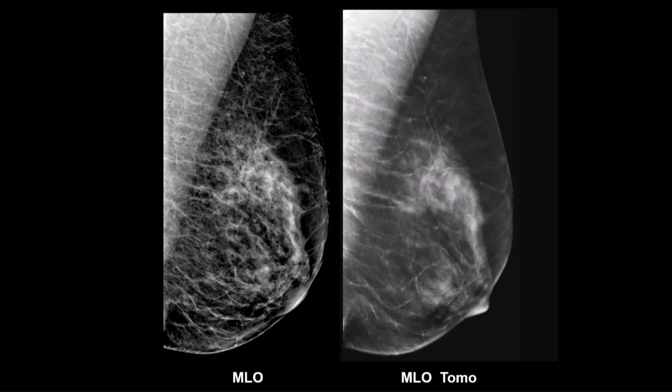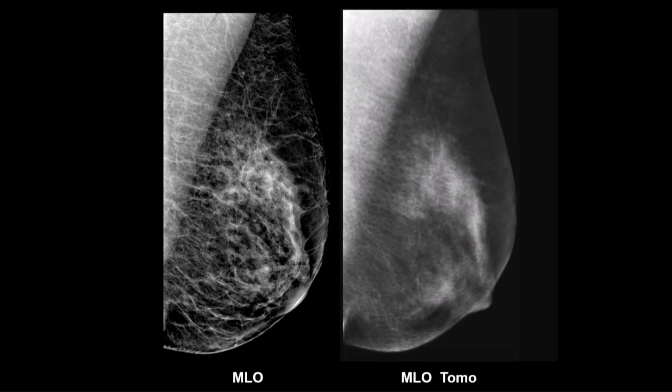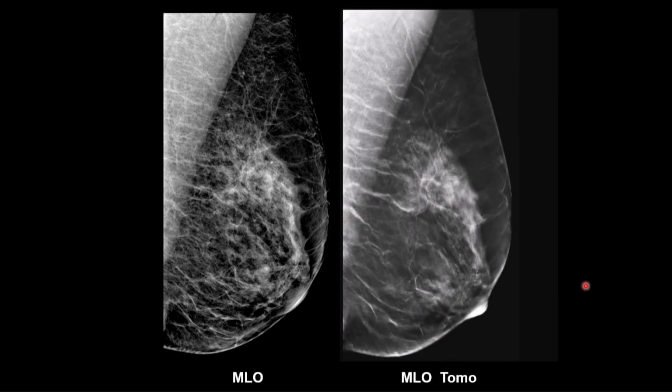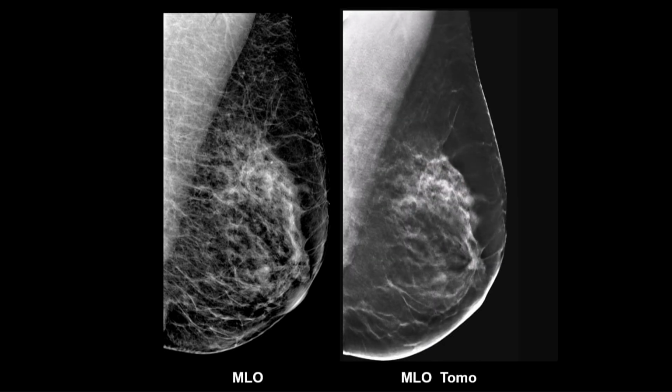And here's the movie, and if you look right where I have that dot, as the movie plays, there it is. Let's do it again. There it is. Now I'm going to try to stop it. There. Okay? I'm not going to even try this.